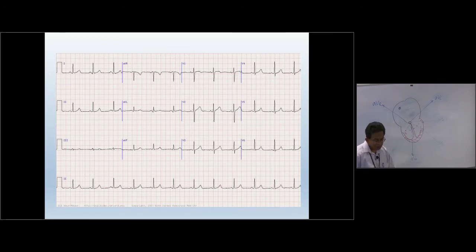Now if this patient is experiencing an anterior wall pathology, these are the leads which are gathering electrical activity of the anterior part of the heart: V1, V2, V3, V4. They gather the anterior surface, and also information from the septum as well, because we know the interventricular septum is just under the anterior surface of the heart. So if something happens in the interventricular septum, it will be represented by one of these leads. The relevant changes will be shown on V1 to V4.